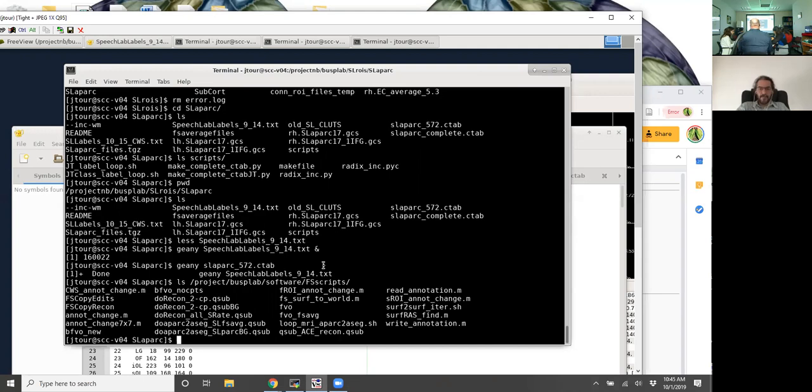We're currently in the process of expanding what we do with the Freesurfer data. So if you have, like Liz, a script that does a bunch of stuff, toss it in here and give it a label so people can tell what it's going to do.